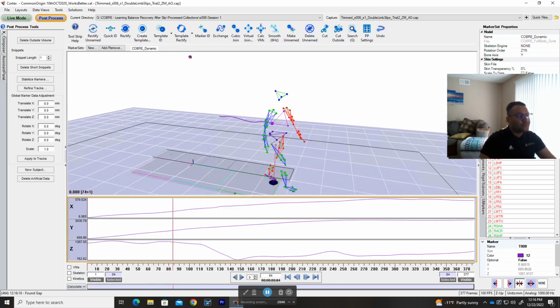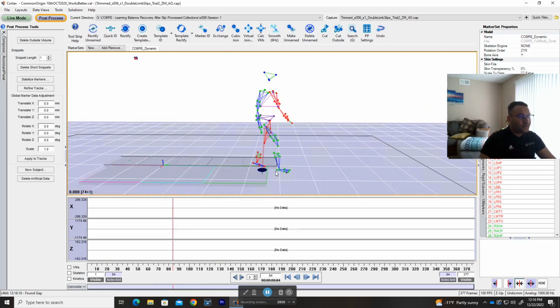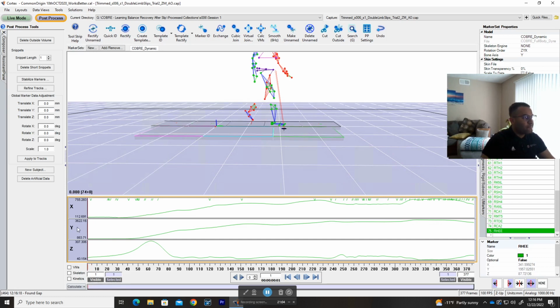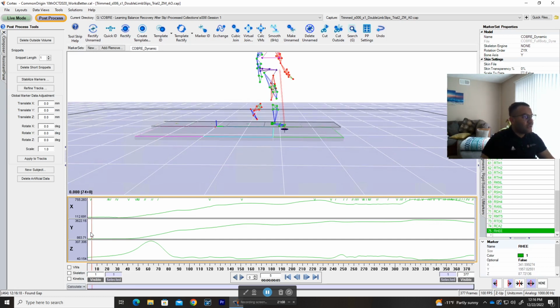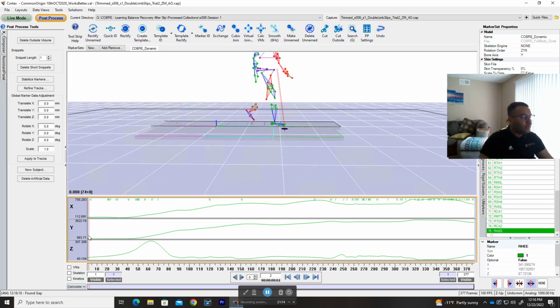Everything is basically processed. But for example, if you have a gap in Mac, unlike for example Vicon or Qualisys, where you can add, let's say you have missing data from the end, or by the beginning of the trial.